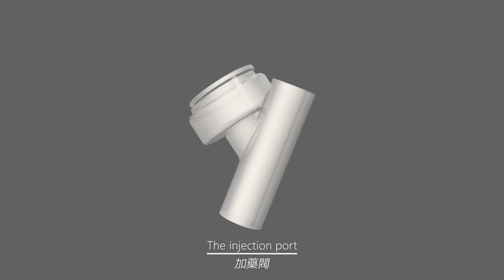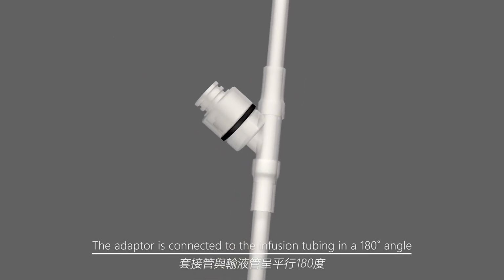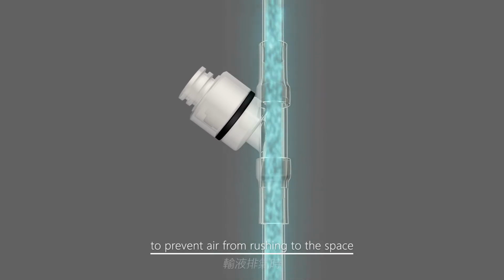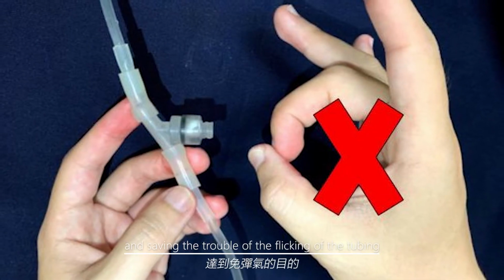The injection port adapter is connected to the infusion tubing at a 180 degree angle, avoiding the generation of an empty space within the port base to prevent air from rushing to the space during the infusion tube air removal process, and saving the trouble of flicking the tubing.